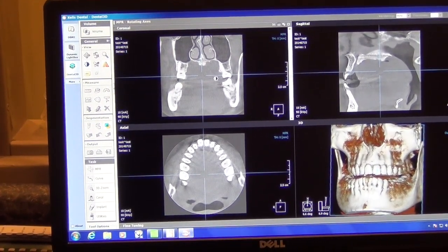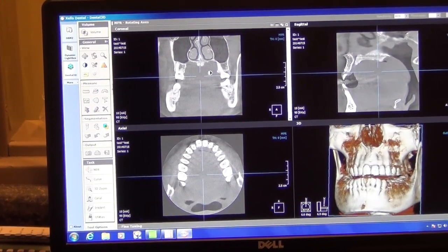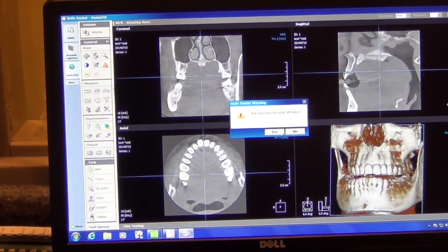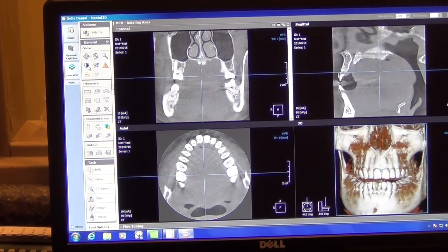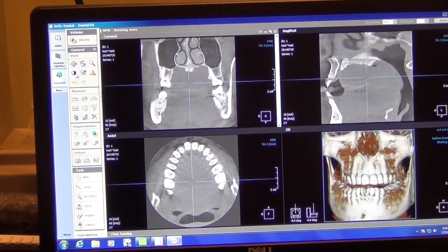And at any time, if any of the options that we've manipulated or changed on the image, if I move my mouse to the top right corner of the window, I can choose reset. And I can always go back to reset all, and it brings the data right back to its original state as it was shown when we came into the image. Okay, let's do that again because that might be something I might be doing a lot of.